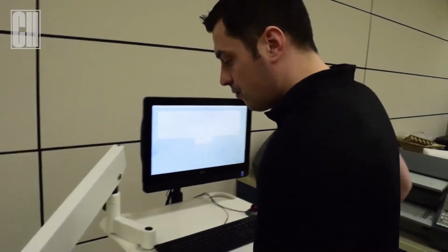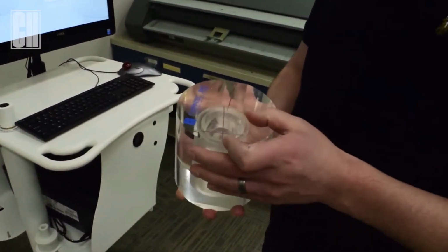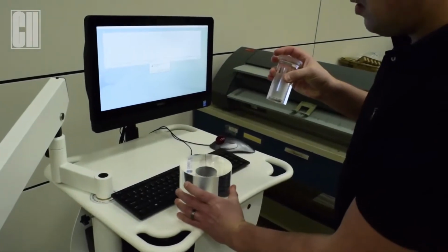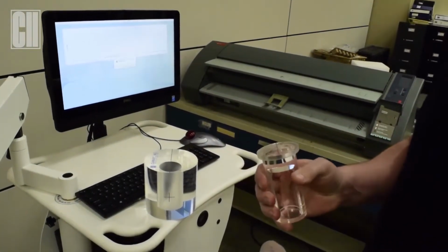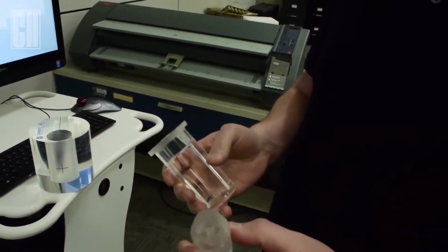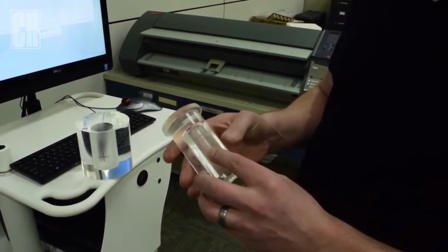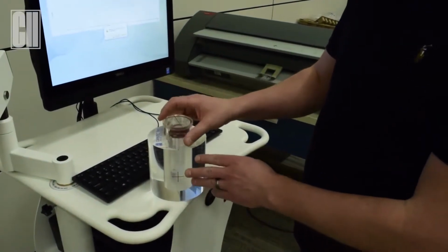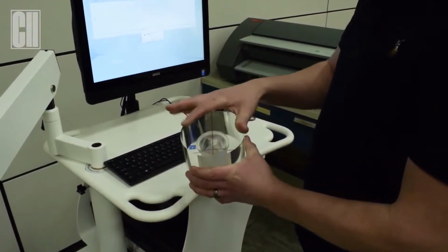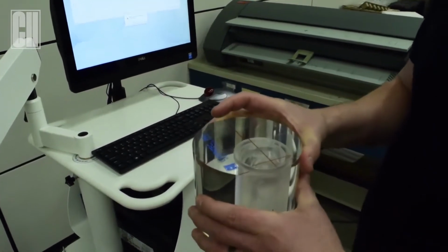Phantom. You will grab your Phantom. Take out your holder, get the capsule and slide it into the capsule holder. Or if you prefer to keep the capsule in the container, you can place it into this centering into the neck phantom. And you want to make sure that the lines cross in both directions and line up, and position it where you want to measure your capsule.